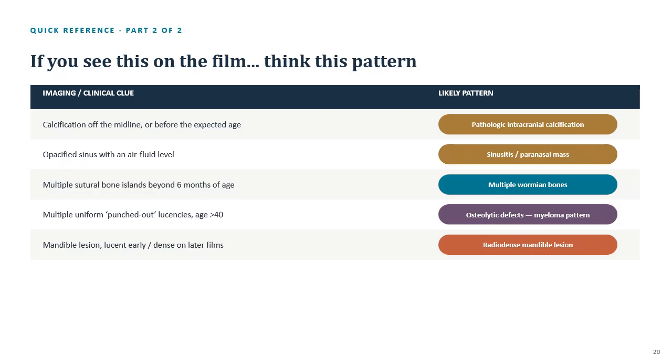Again, these are just patterns that we just learned about. We're not diagnosing the patient, but if we can identify that something looks abnormal, it might get the patient to their follow-on treatment faster, especially if we can bring it to the radiologist's attention prior to allowing the patient to leave. So again, looking at the patterns, not necessarily trying to memorize or recognize the patterns, but just have an idea of what these patterns look like, coupled with the clinical history and also the patient's age and some of the locations of these things can help us just be better at our job.